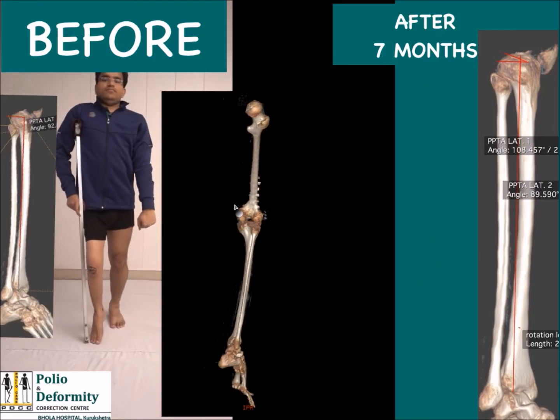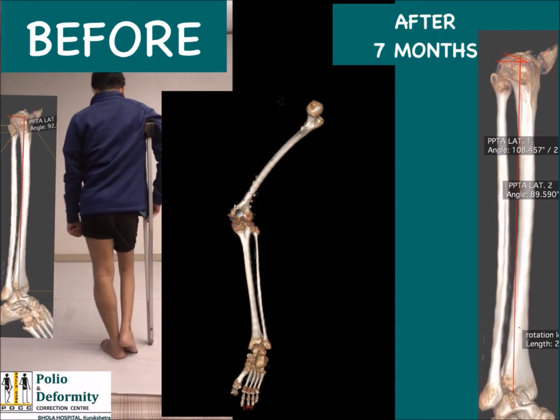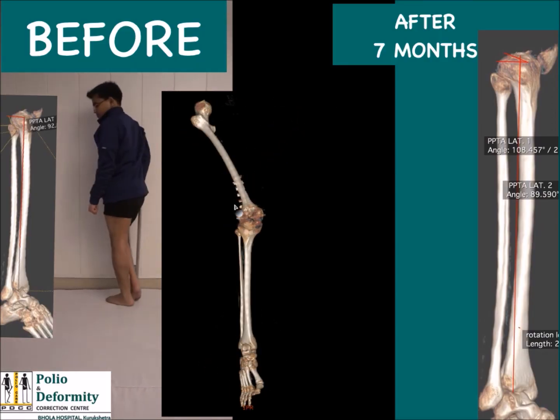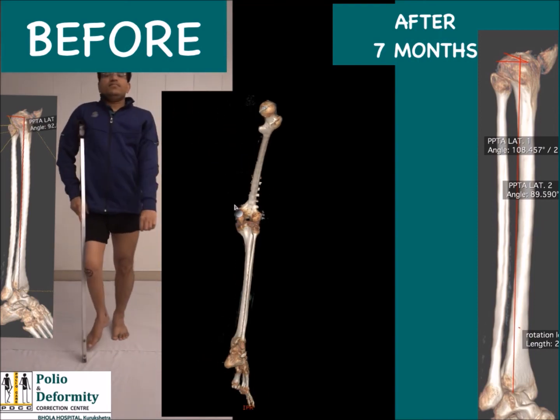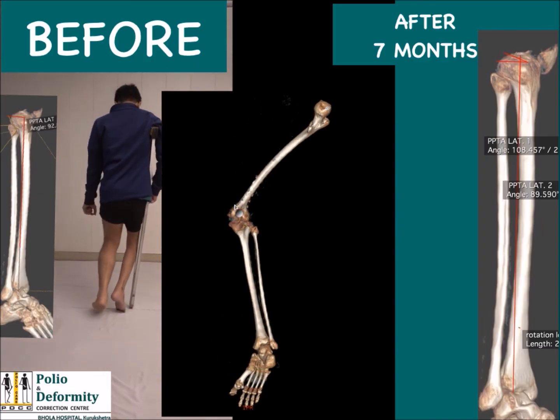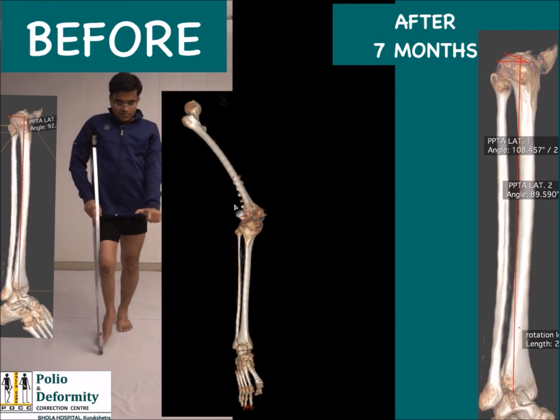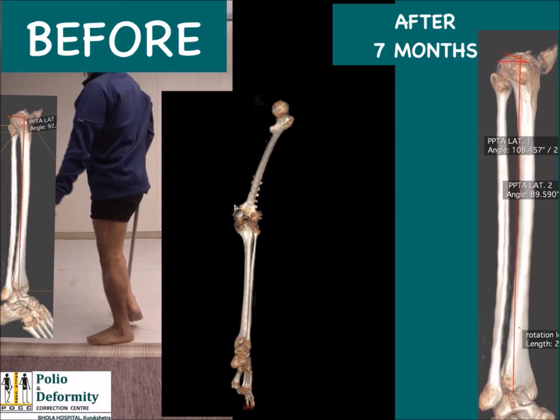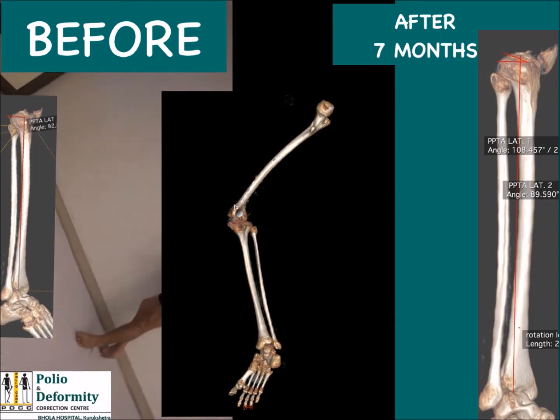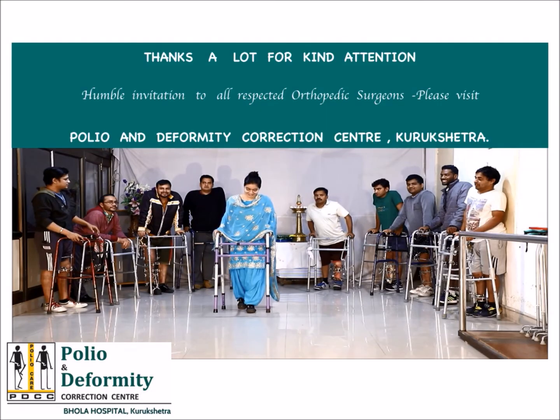And dear friend, in complex deformities which are at multiple levels, multiple joints, with all the planes involved, frontal, sagittal and rotational, this is a boon. 3D CT scan can be used in single, double level or multiple level deformities in a single plane or multiple planes.